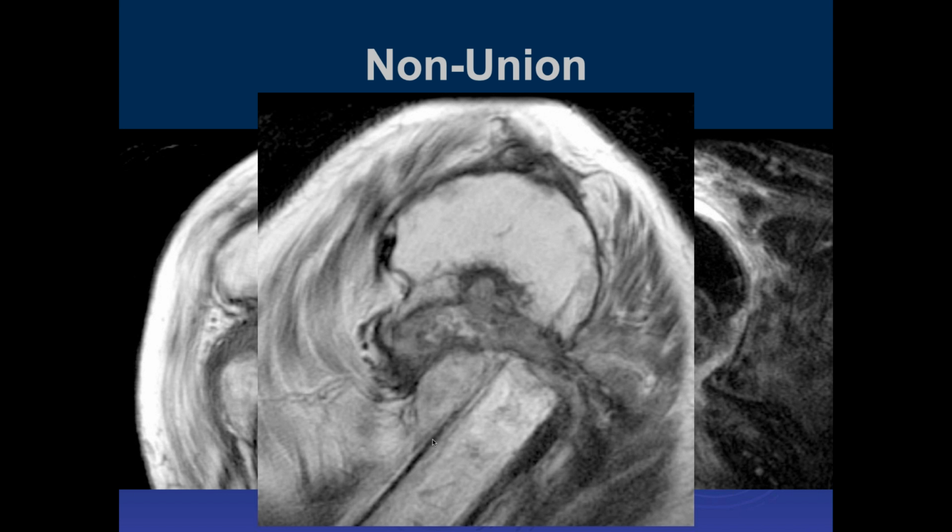You start adding weight, that's what you get right here every time. This is hypertrophic bone, showing the chronicity of the disease. What happens with patients when they have this injury, they try to test it to see if it's healing or not. And by testing it, they keep moving the shoulder.